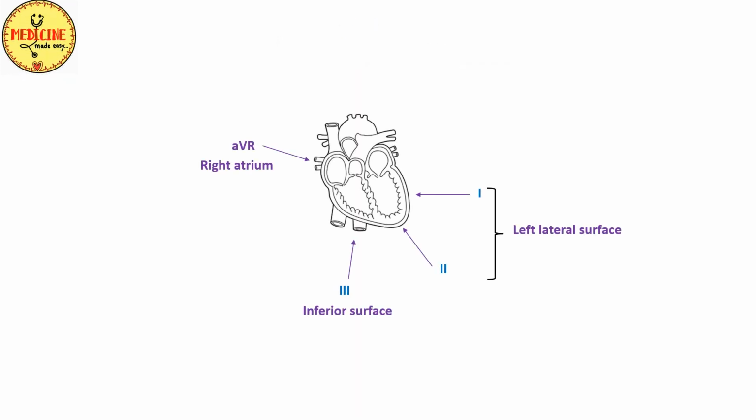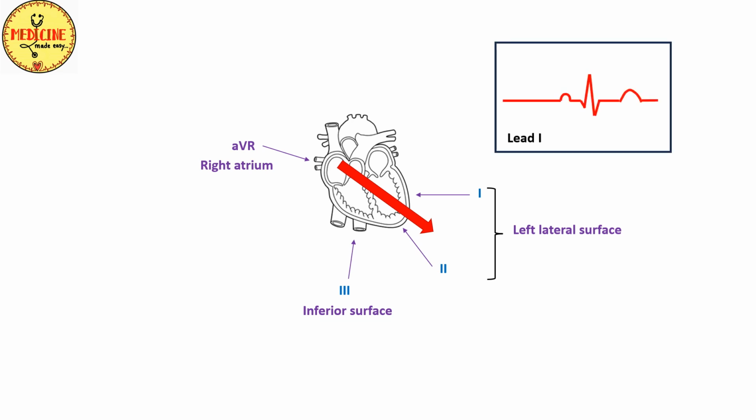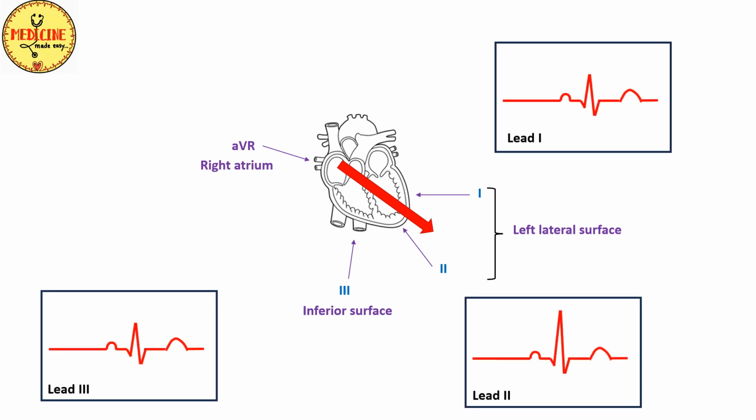Now let's move on to interpretation of cardiac axis using an ECG. We have already learnt about how different ECG leads look at the heart in previous videos. First, let's consider the normal cardiac axis. It will usually fall between the limb leads 1 and 2 as shown in this diagram. Since this normal axis is moving towards leads 1, 2 and 3, they will have the size of their R waves greater than that of S waves as shown here.